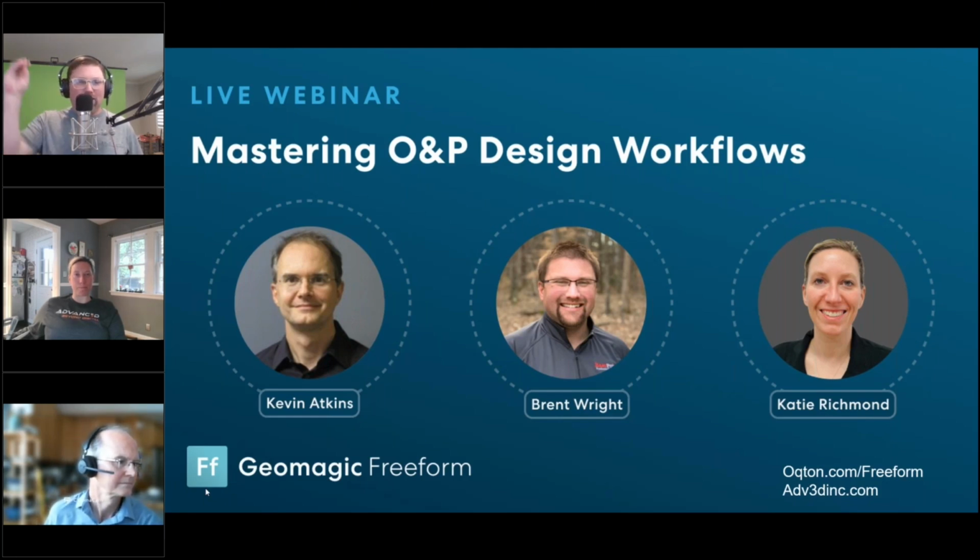I think the Dynabot's kind of like the cherry on the top, but you do have to know how to do some of this stuff, or be taught how to do it, before you jump into the Dynabot side of things, so you know what's coming. And we've created a Dynabot that works amazing on one product, but we change something just a little bit and then it doesn't work. So how do you get the best of both worlds? And how do you create these building blocks or chunks where you can merge some of your Dynabots together to get what you want?